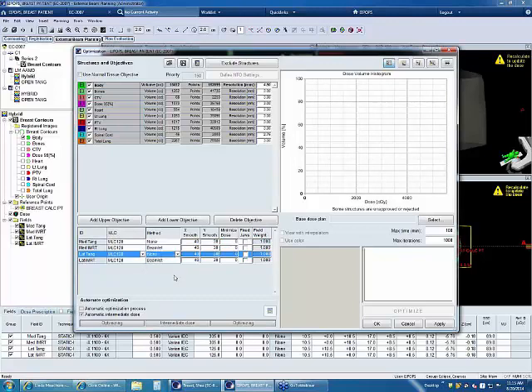Okay, now the optimizer will not see those two fields. I'm going to come over here and fix my jaws because I don't want to lose any of my flash or breathing room for my patient. And I'm ready to go as far as the fields are concerned. I do need to put in objectives. I'm going to come up and get one from my template section.